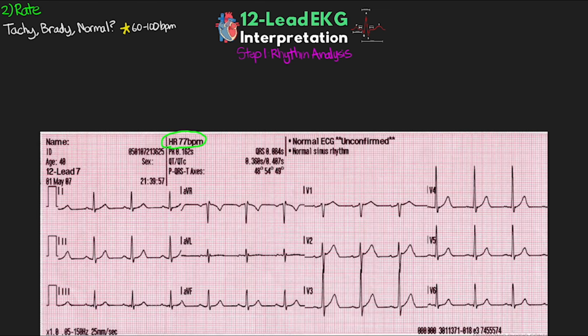But we also want to confirm everything that the computer tells us. This includes all of our other measurements, any interpretation. We want to confirm all of that with our own eyes and basically determine whether or not we agree with what it's saying. The computer is certainly great at giving us a lot of good information, but it sometimes can be inaccurate or just not sure of exactly what it's seeing.